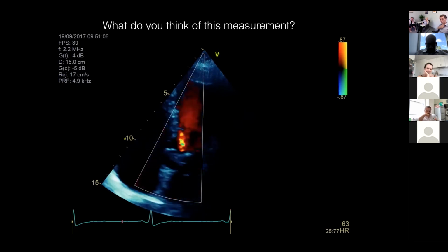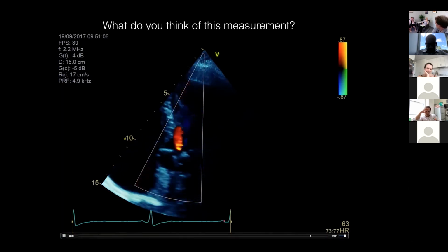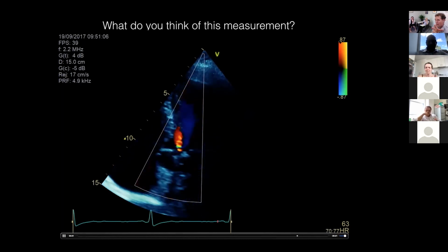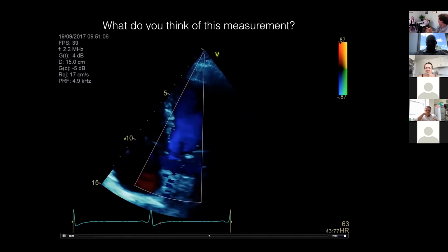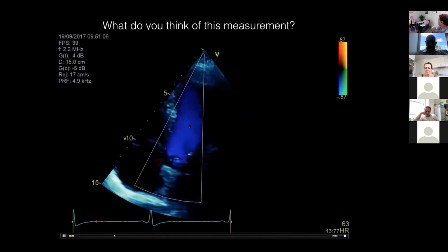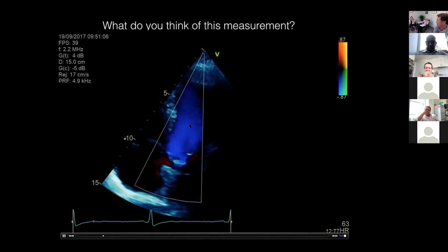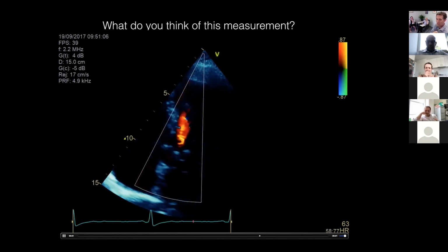Cool. I guess the other thing that would flick through my mind is that we've got quite a high scale here. So never forget, if we show you a picture that's got color Doppler in there, always have a look at the scale, right? Because with that level of 87, it is going to make the aliasing less, and it would make the regurgitation look smaller. Fantastic. So that means that regurgitation could be quite a lot. And I stole this picture from the one that we saw before, the LVOT VTI of 32. And that's why they've got an LVOT VTI of 32, because of this regurg.